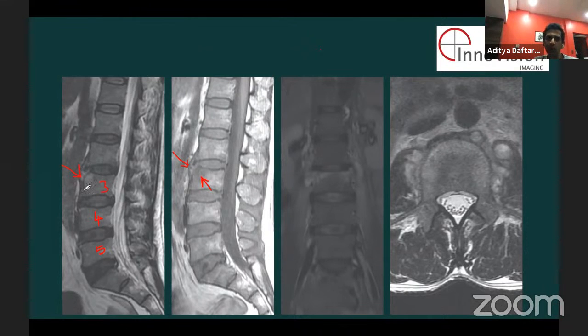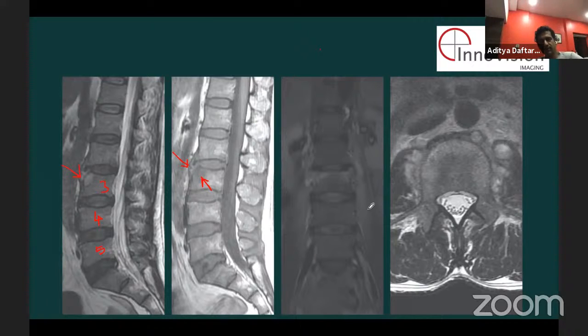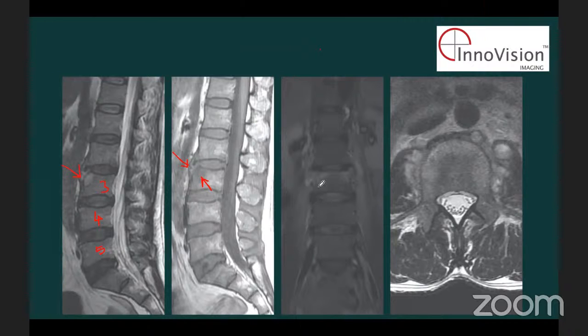could be fluid or fat. When you see the T1 weighted image, you say it's dark. So this is not fat anymore. This is fluid and this is edema. Yes. Correct? Yes, sir. And now this image here. This is a STIR image, sir. Yes, very good. Which shows again a hyperintensity below the superior end plate of L3 vertebra.